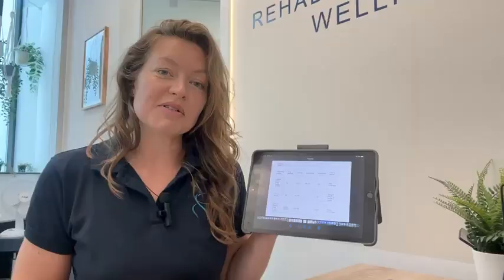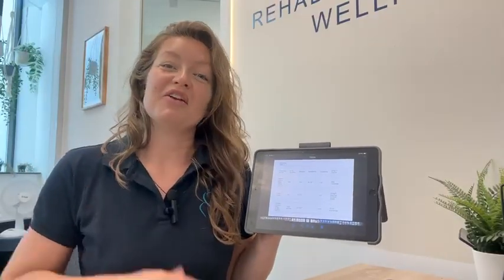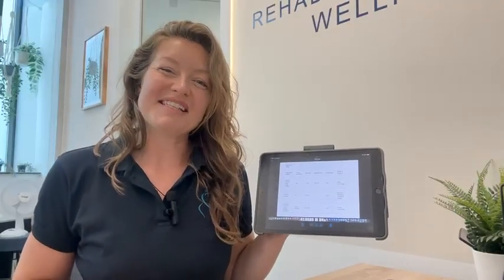So in terms of our angles, what we're looking for is that your angle is ideally between 0 and 10 degrees on your X-ray for your Tönnis angle. Anything more than 10 degrees is regarded as something that's going to need further investigation to see what's going on, to see again what other treatments, what other help and support that we can offer. Having more than a 10-degree angle is just an indication of slightly less stability within the joint.